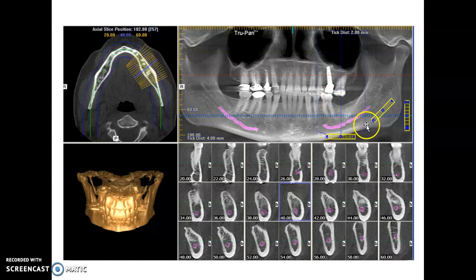And so what they're showing you in particular here, just to give you a little bit better visual, this is the mandibular canal. You've got your mental foramen here, mandibular foramen is up here. But they're showing you that mandibular canal. So you notice you don't see it here. So this is the start. You don't see it here in the first few images. Then you pick it up in image 4. So this is about right here, or the fourth little slice about right there. Okay? Each of those slices, you can see that it gets larger until the mandible begins to narrow as it's going up this angle here.